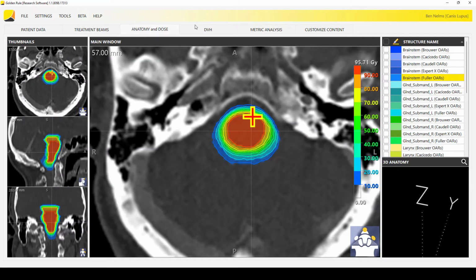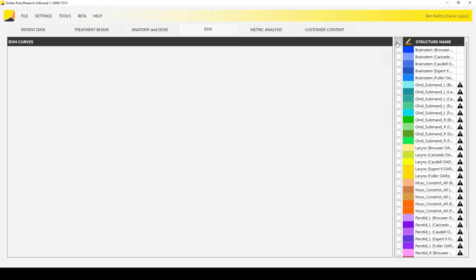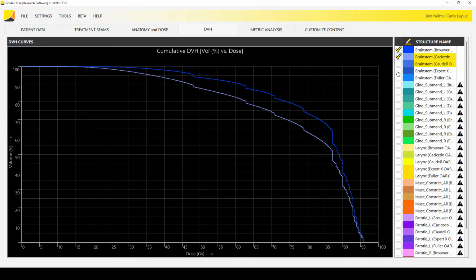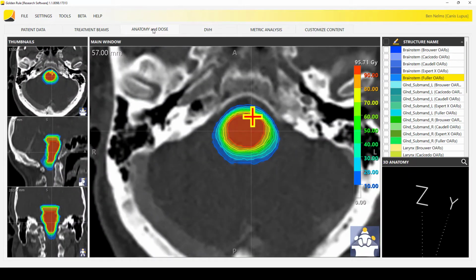Let's go back to the view. By the way, a pretty interesting view is if we look at the DVH and turn the experts on: instead of a dose volume histogram, it's a consensus volume histogram. This is kind of a neat thing to look at. For a perfectly agreeing contour versus a consensus that was completely in agreement, this would look like a step function. We can start to learn how to interpret these as well, and maybe we'll do that over time, but not today.